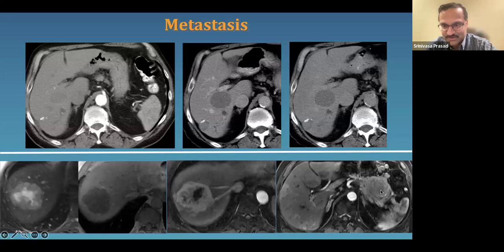And this was a case of a pancreatic tail neuroendocrine tumor with metastatic disease. So typically, we'll have a history of a prior or treated malignancy, and one can see typically multiple tumors in the context of an existing primary. The diagnosis is straightforward, and typically the histopathological examination is essential before they start on any of the therapies.